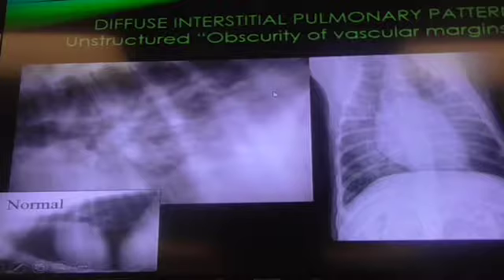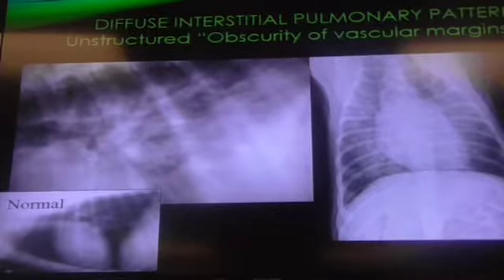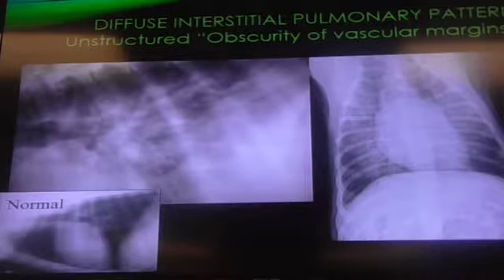So this is where the gray zone happens. Some people will call this bronchial, some will say interstitial, some will say bronchointerstitial. The goal is we have to treat the patient, right? Whether the disease is in the airways or the interstitium. So what would you do in this patient? If you say bronchial, what's the next step? A bronchoalveolar lavage? Maybe? If it's interstitial, what's the next step? It's still lavage.